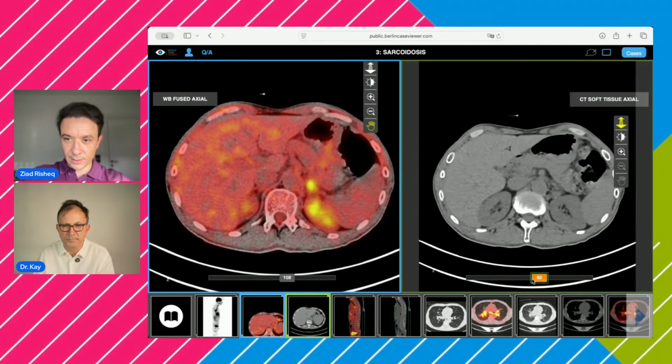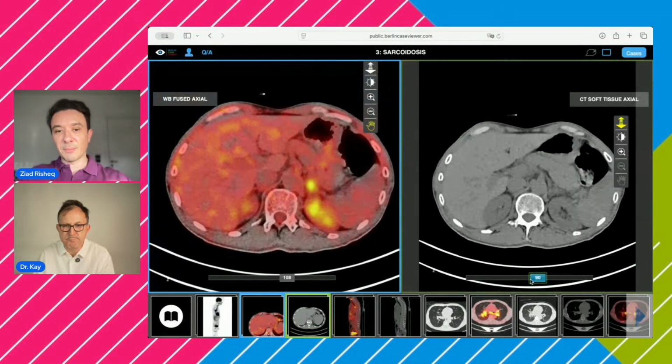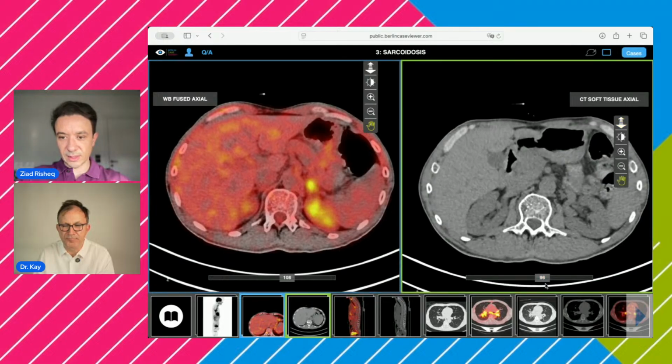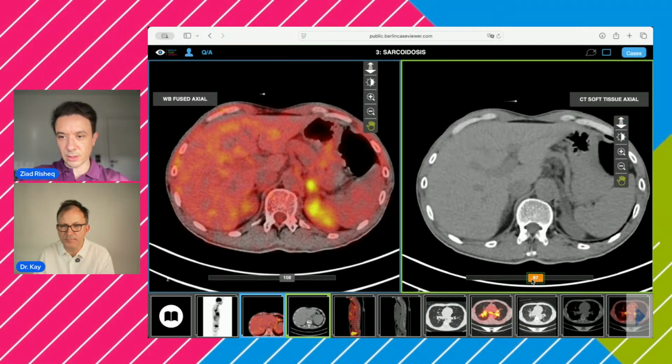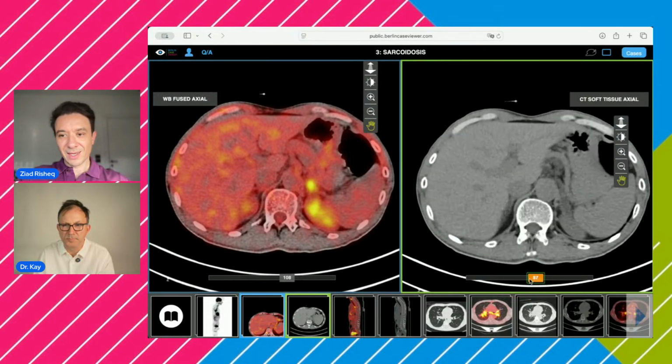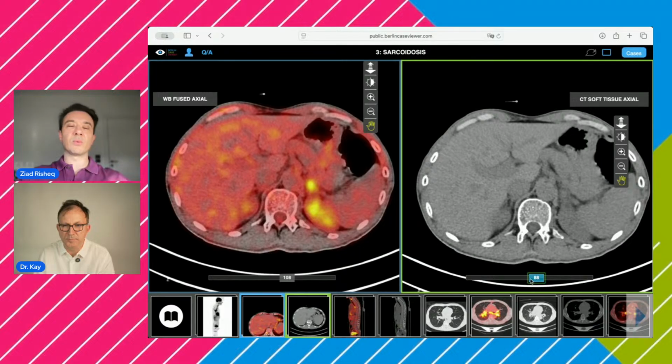It is showing uptake. So if you look at the CT, it depends on what CT acquisition you do. I do a diagnostic dose CT with a 2 or 2.5 millimeter acquisition. I know a lot do 5 millimeter acquisition, low dose non-diagnostic CT, but I think you can't actually make a diagnosis if you just want to do the PET scan and just report hotspots, just saying that there are a bunch of hotspots somewhere. But if you want to solve the problem for the referring physician or the patients, you have to do a diagnostic CT.